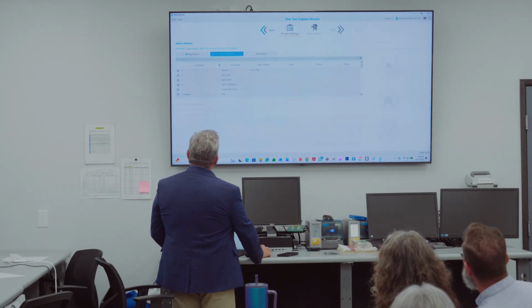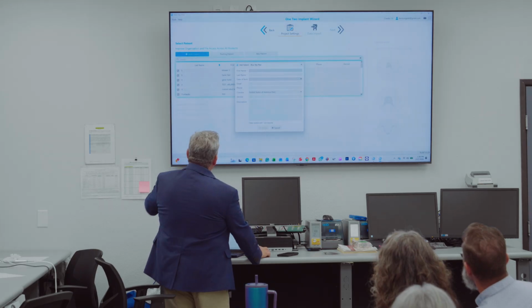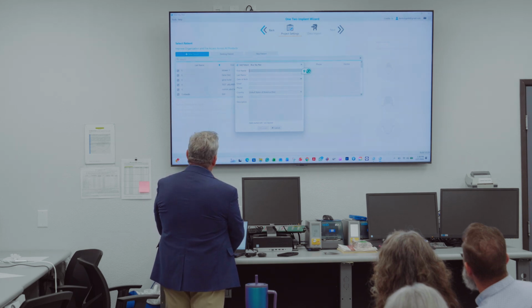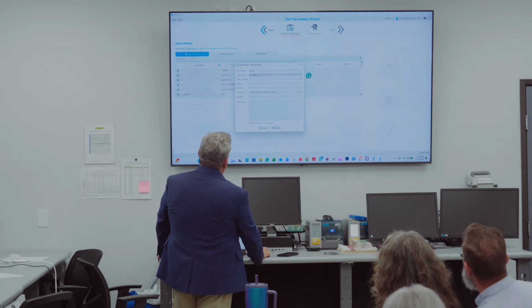So if you recall, before we had to create a new patient, so I'd like you to go in and click new patient, and just create a name for this case. It's gonna be a lower, so do whatever you wanna do, lower, this is gonna be lower Las Vegas. Okay? Just like that. And go create.